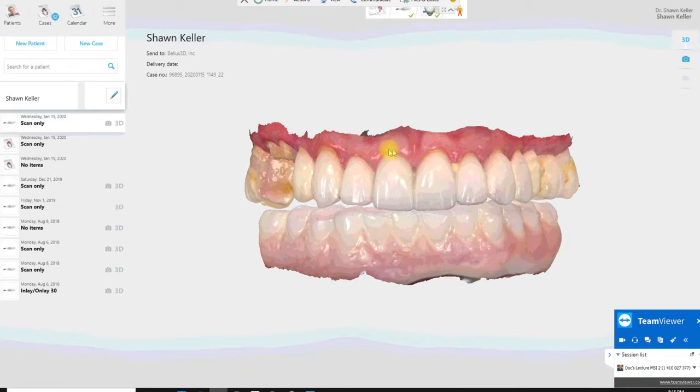Remember, take the time to trim your scans here, and everything will go faster. It'll download faster. You won't jam up the iPad. Cut it right here where the gum goes from light pink to dark pink. That's the mucosa. This is the attached gingiva. We just want that. So go over to the 3D and right click and go to export, and I'm exporting scans.